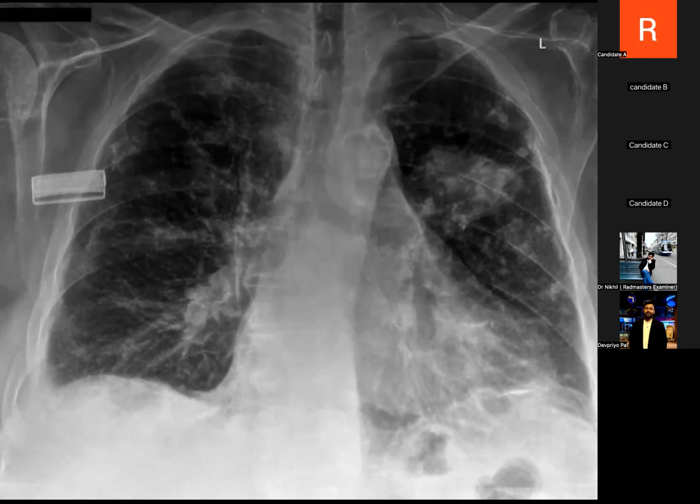Are you sure? Yes, there are subtle calcified plaques along the left hemidiaphragm I can see. Apart from this, the bilateral hila are slightly bulky. However, eggshell calcifications are not well visualized. I would confirm on the CT images.